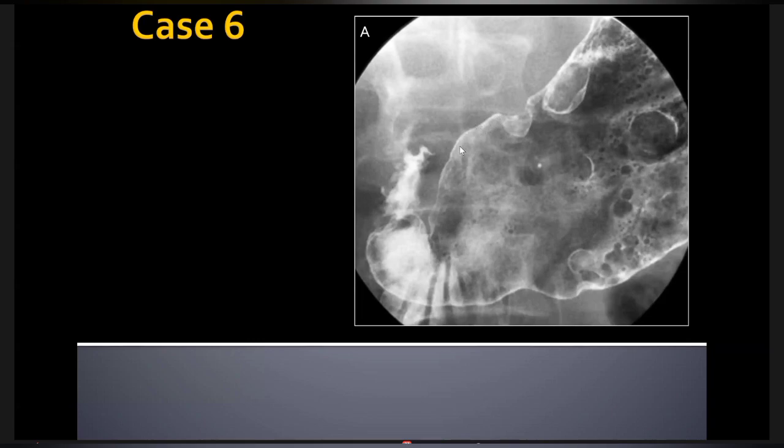Okay, so can you see my pointer? Yes, ma'am. So this is mucosa here, yeah? You can see this white line. It stops here, the mucosa carries on, but it's here. The mucosa is actually going around, and you can see this area here. The reason you're not seeing it there is because the mucosa is actually pushing into the lumen, yeah? So this is a polyp, not an ulcer, yeah?